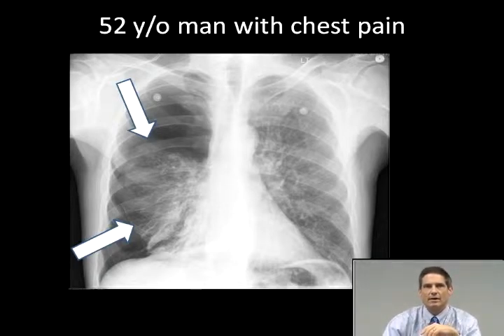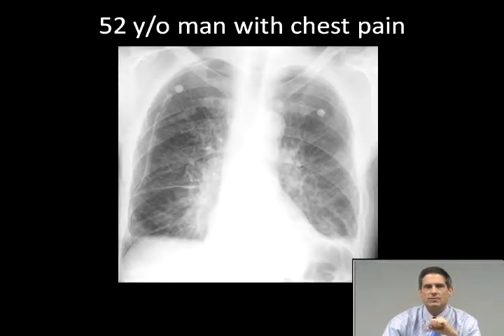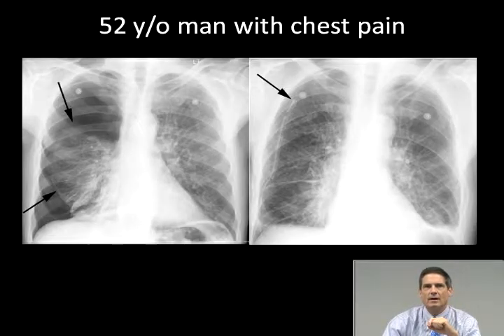This fellow had it recognized pretty quickly and got a chest tube. This picture shows him before and after placement of the chest tube, and you can see his lung has reinflated nicely.